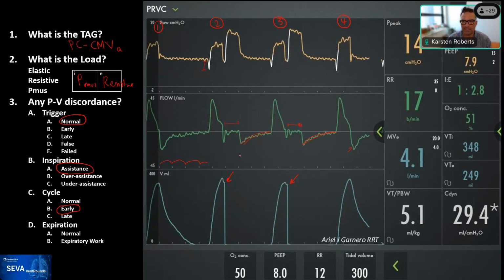So what's really happening? A couple of people in the chat mentioned that the breath looks forceful, and Ari pointed out that the volume cuts off in the second and third breath. So what's really going on here, where we see really no flow during the first portion of the expiratory part of these two breaths? I'll ask the question, what can cause this?